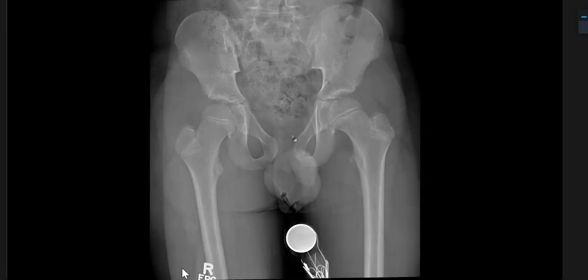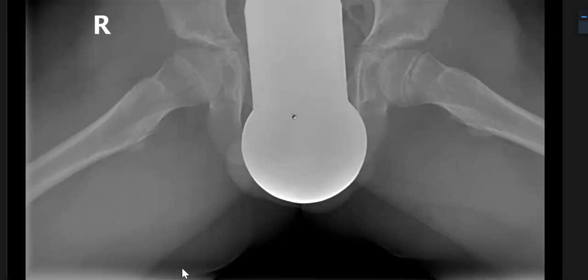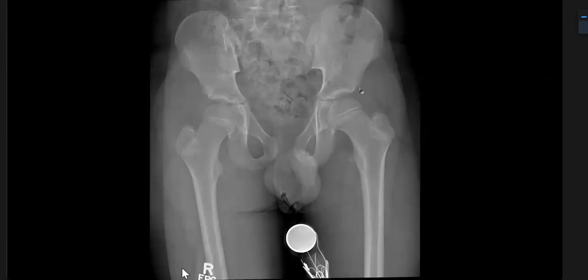And then, obviously this is a young child. These are all positional things. The genitals are not covered here, unfortunately. So it's the first scan. I think they have deliberately uncovered it. But here they have covered it. So you do not talk about those things.